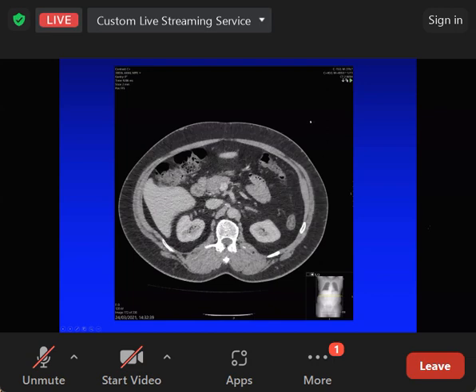Generally, if you're not sure of the level of grey of a particular structure, you're not sure what it is, you can go to something that you know. So for here, for example, is a bit of colon, and then we've got some dark bits. Well, it's as black as this, the air outside, so we know this is air in the colon.